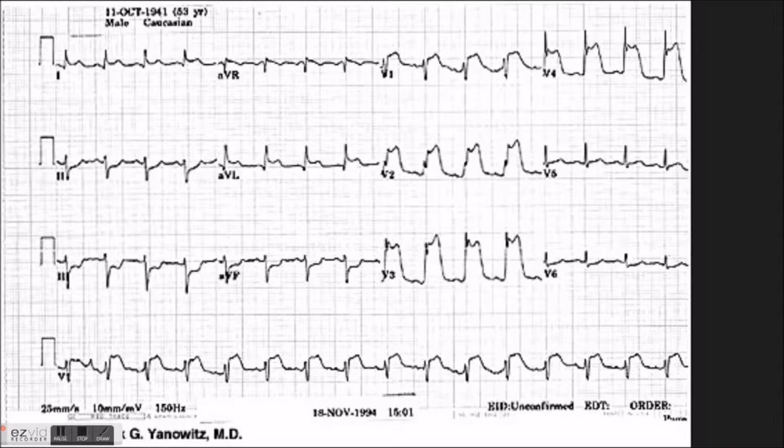All right, so probably the first thing that jumped out to you on this one was V2, V3, and V4, and even a little elevation in V1, right? So a large area of infarct. Certainly the left anterior descending is what we would anticipate is infarcted here, and we'll go over that on a chart here in just a second.